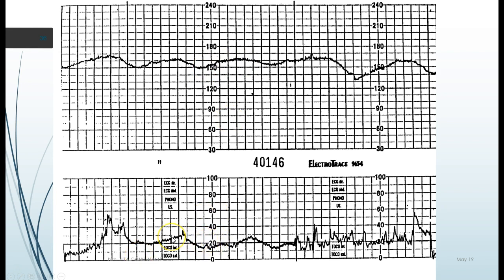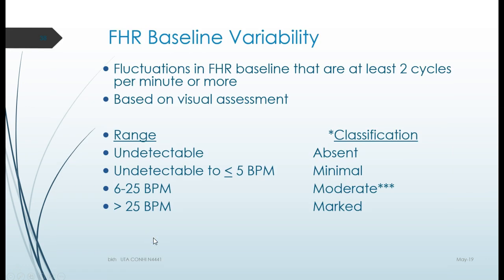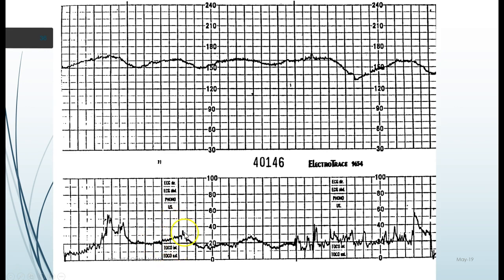Because remember, we cannot call a baseline. Baseline is in between contractions. So that looks like maybe over here, here's a contraction. This really has not returned to baseline. So she's still having some kind of a contraction right there. Whoops, sorry about that. She's still having some kind of a contraction here.